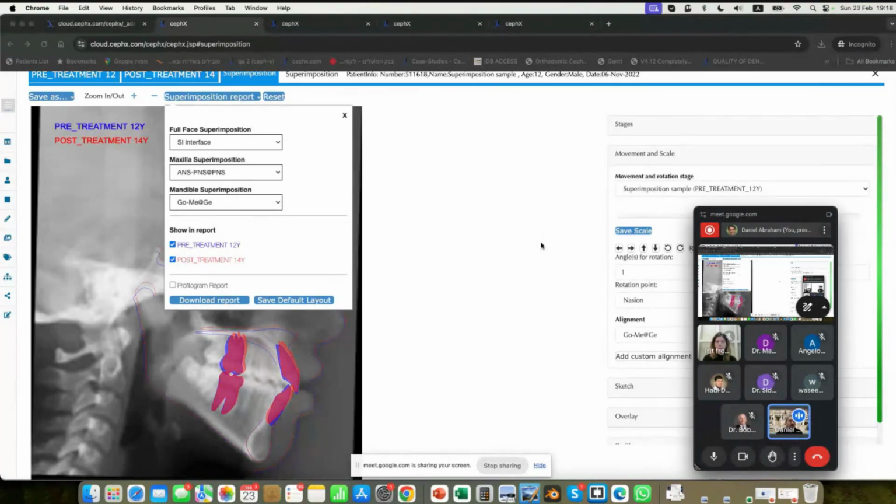Okay, so moving on to the 3D side of things. We have the ability to accept CBCT files and intraoral scan files in order to do a number of different operations on them. The basic thing we do when we get a CBCT is a bunch of analyses. So we do an airway analysis, we do a segmentation, and I'll show you all about that in a minute.